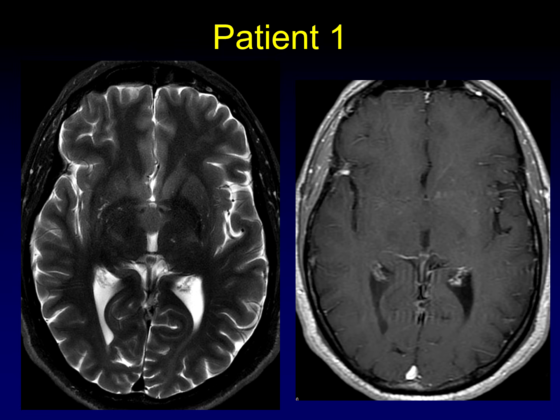Here's patient number one. I'm just going to point out the mass because it's actually kind of subtle. It's right here in the midline, there and there, and in this post-contrast image, well, it just blends right in. It's a little bit brighter than the surrounding brain parenchyma.